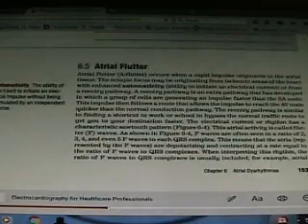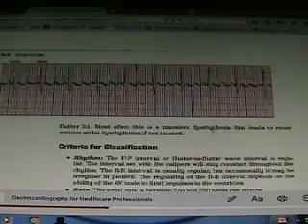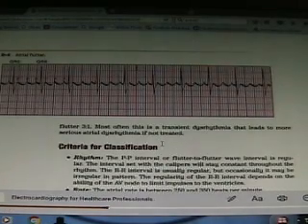Atrial flutter. Okay. This is when your atrium starts to break down. And if you look at it, doesn't the little P waves look like it's swimming? Like flutter kicks? You know when you kick in the swimming pool? Doesn't that look like a swimming pool when you kick? Your P wave is fighting to stay normal. Look at that craziness. That's not good. Okay? It's trying to stay regular. And the atrial rate would be just crazy. Look how crazy it is.